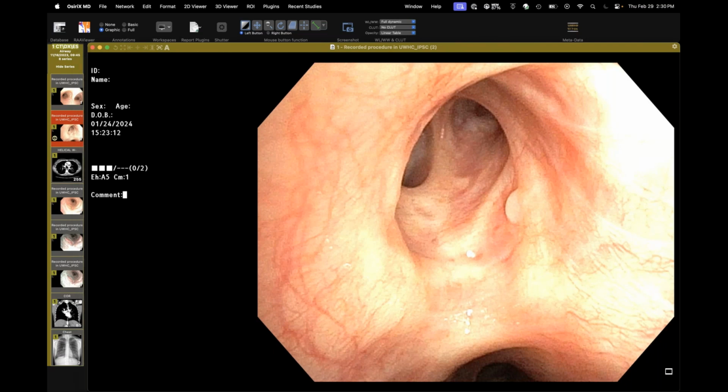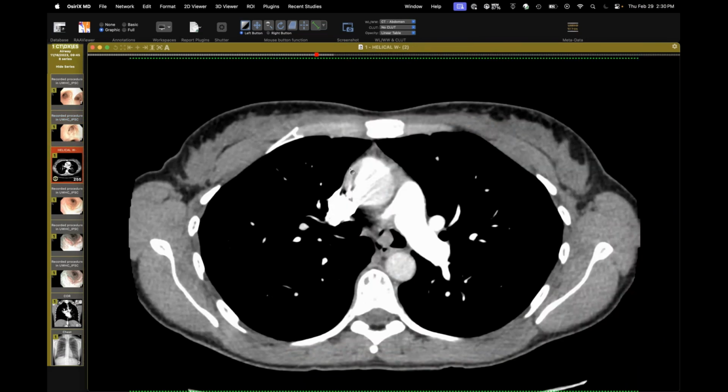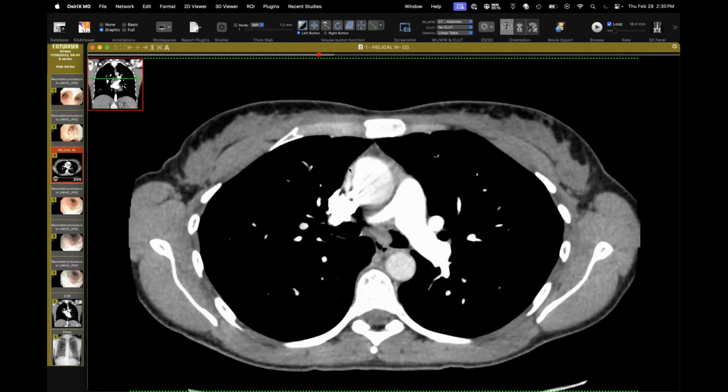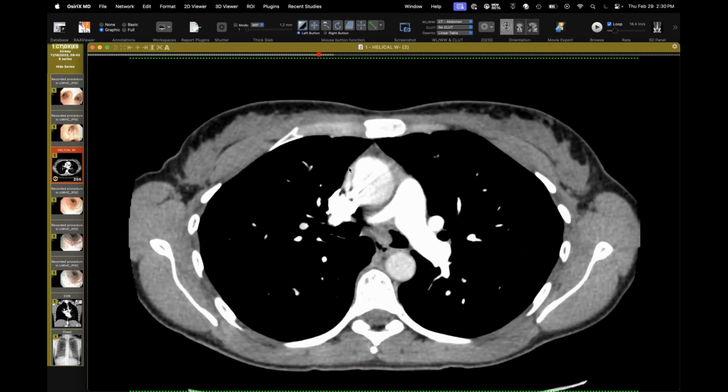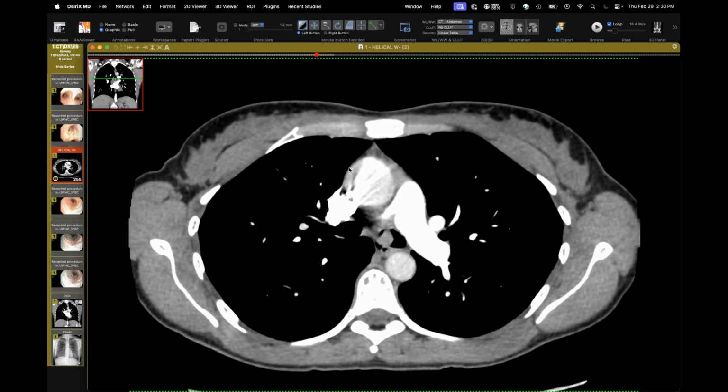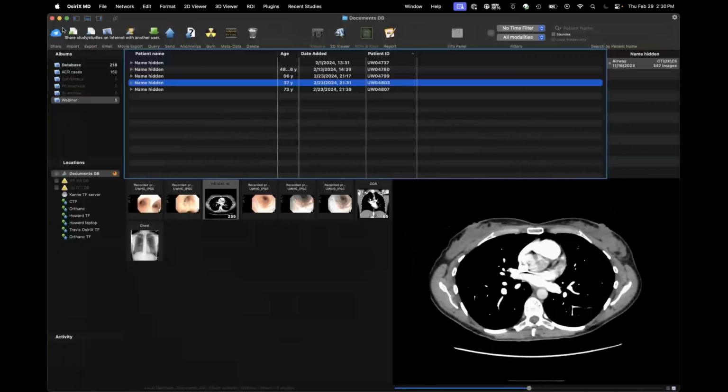So 2 of them in the airway. That's added to your differential for airway nodules. This patient was a never smoker, a young patient. There's nothing specific about the imaging, and you don't always see them here. I've seen them in the lungs a few times, but these are the first two I've come across in the airway in a while. So 2 cases of that.